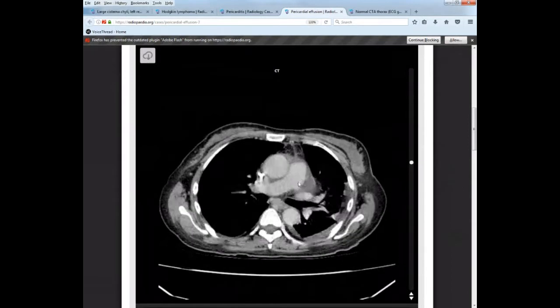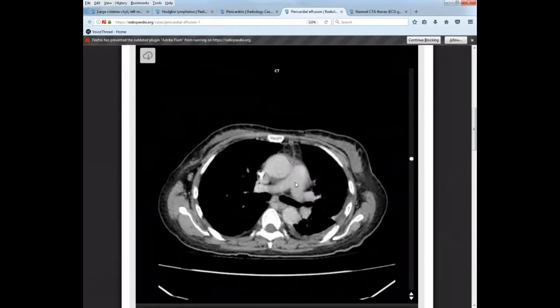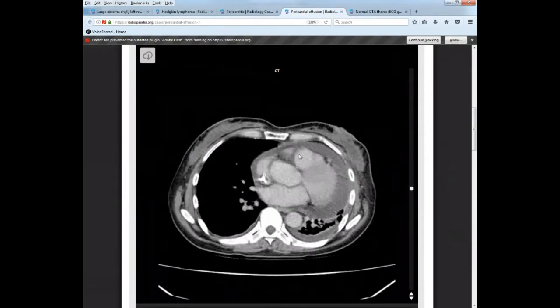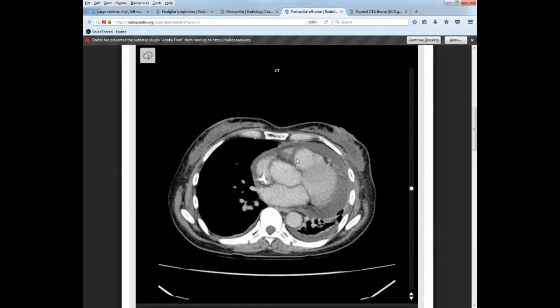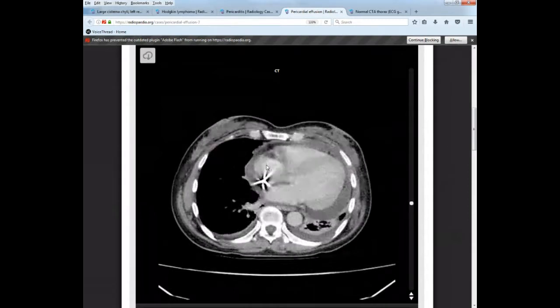This is our pulmonary artery. I think it's easier if you see the pulmonary arteries, your main branch, your main pulmonary trunk, and then your right and left branches. And we know that that comes from the right ventricle. So if we go down, here's your right ventricle. So follow that down, that's your right ventricle here. And then that gets your blood from the right atrium, which is here.